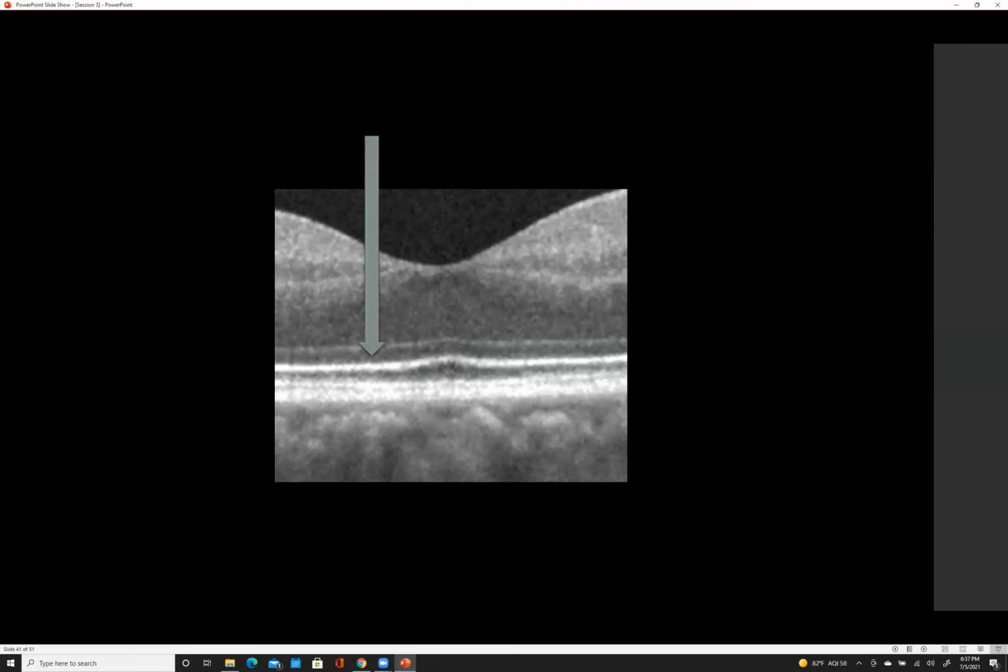Okay, what's that one, your favorite? My favorite, myoid layer, which is the mix of intracellular organelles. Yep, and you name one. Ribosomes, Golgi. Perfect. How about that guy? Okay, so here we have the interdigitation layer, which are the apical processes, specifically of the RPE. Yep, and what are they interdigitating with? With the cones and rods in the above layer.